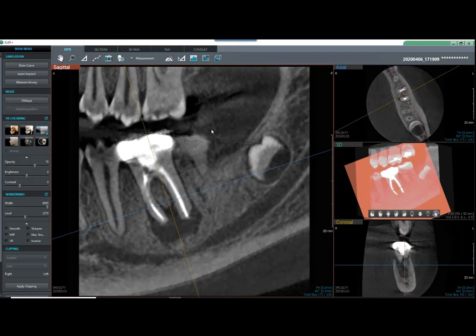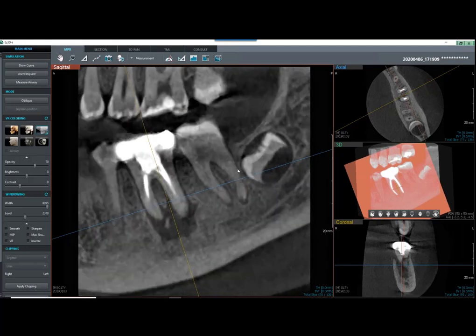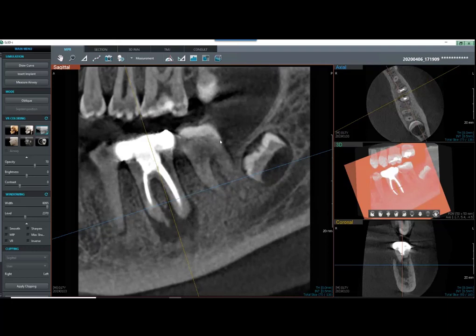We looked at our larger scan for secondary findings. We found our implant site. We found our 4 molars. We even found a couple MB2s. But here we did a small 5 by 5 specific for our tooth, but we can also see an impaction here. Is there any relationship to that second molar? But Paul, let's go ahead and look at this for endo.